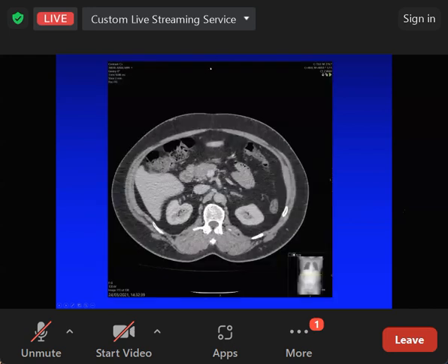So here's just an example with a cross-section of the abdomen at the level of the liver and the kidneys, and you'll see that air around the patient is very black. Fat is fairly dark, and it's darker than soft tissue. There's muscles of the abdominal wall, there's the liver, there's the kidneys. But the soft tissue is not as white as the bone. And bone, you can see that the cortical bone is particularly white because it's very dense and absorbs a lot of X-rays.